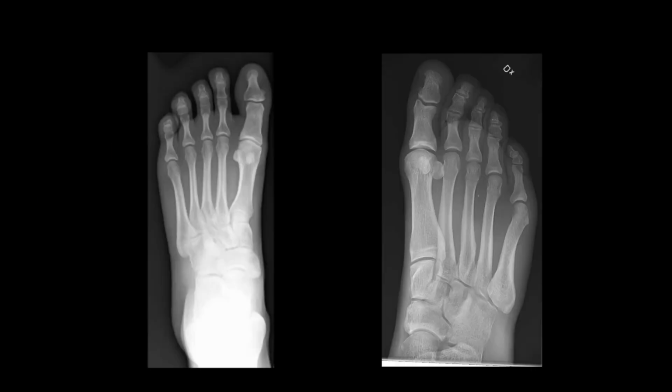So moving on to foot x-rays, again we have two views, so we have our AP view and we have the oblique views. Using our ABS system again, we want to look at the alignments of all of our joint spaces. So we have our interphalangeal joints over here, and we want to make sure all of these are correctly aligned. We then have our metatarsophalangeal joints and our tarsometatarsal joints over here.